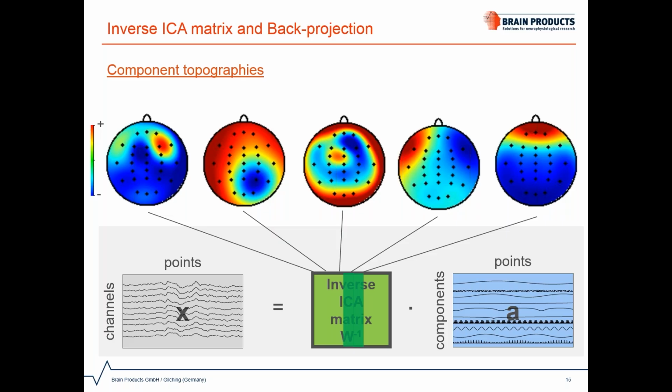The component maps indicate to some extent which channels were mostly affected by a component. Please note though that the absolute values of the maps are arbitrary, and different component topographies should not be compared numerically. Also, both warmer and colder colors indicate larger weights, so the polarity could just as well come out inverted due to the way the weights are extracted.